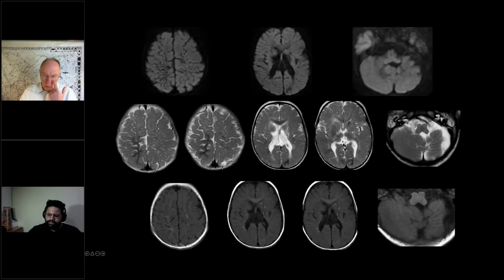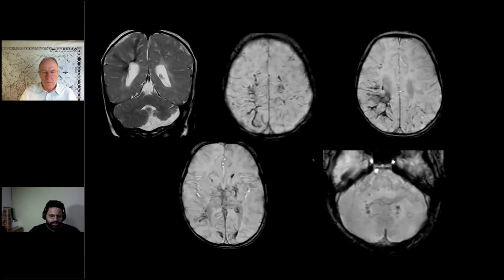Okay. There's volume loss of the thalamus also. So these are all related to old injury. Whether the injury was an acquired injury or is it something with a genetic disorder causing this is the question. I don't think there's a relationship between the tumor and the parenchymal changes.